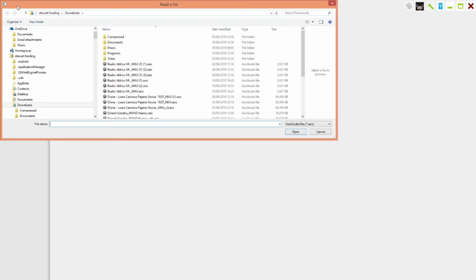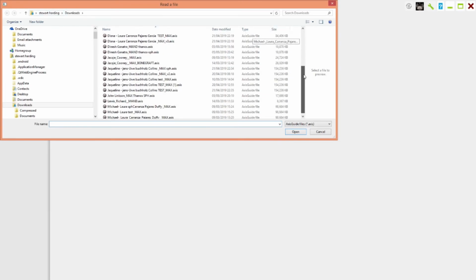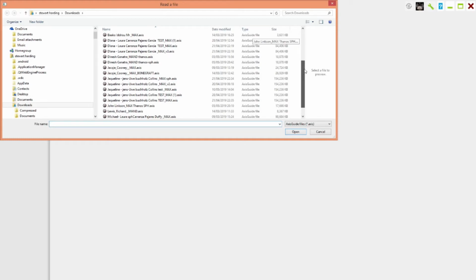We're going to be using just the planning option, not the image option. And for now we're going to be opening up our plans by clicking here. Do not bother with opening up the DICOM files, but open up the planning files. If we click onto the planning files, you'll be able to see a whole range of files that are ready for us to plan our implant placement.